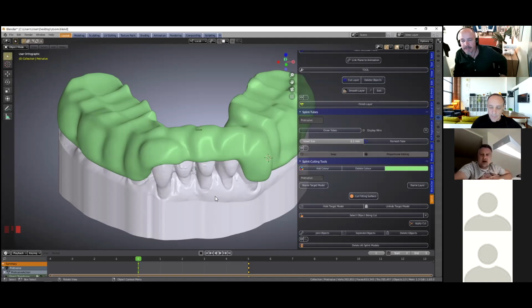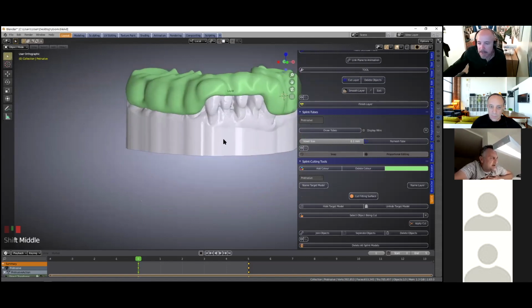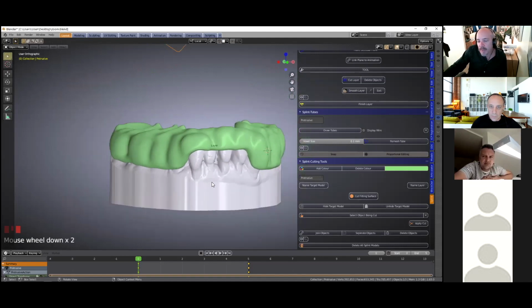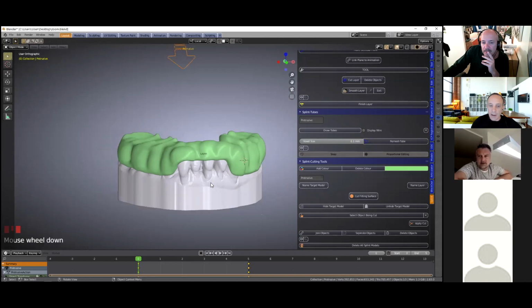Yeah, so at the beginning of the process, when you started the splint design, you actually gave a dimension of also thickness of the splint to be a bit higher because of knowing that at the first stage the splint will penetrate half of the measure into the model? Yeah, you double your value because it penetrates halfway into the model.